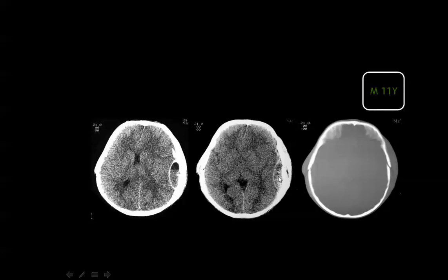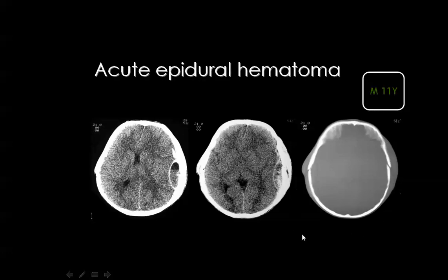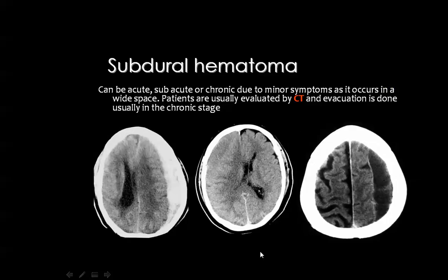Then if you see a hematoma like this, you can expect that this is a relatively subacute or chronic hematoma, but considering the recent history of trauma, the presence of fractures, and the presence of subgaleal blood, this is an acute hemorrhage, but the acute hematoma here is not that bright because the patient is anemic.